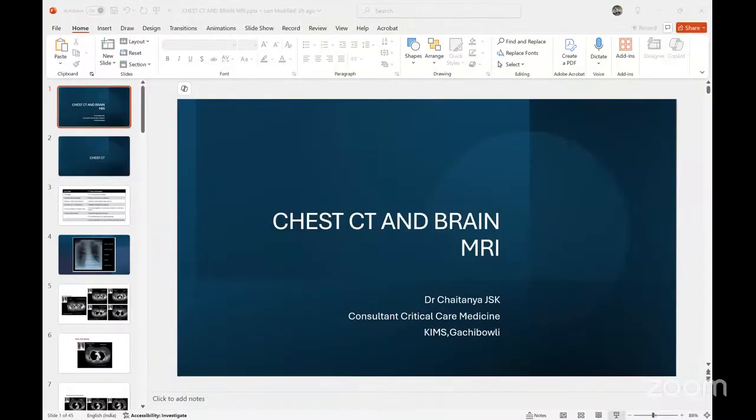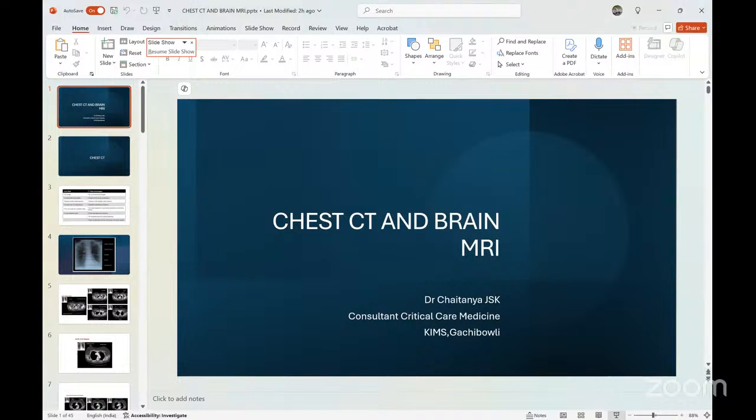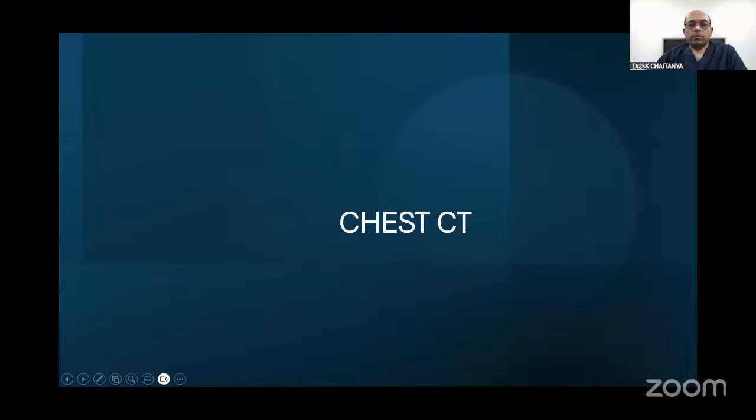Yeah, thanks for the kind introduction. I think 2 weeks ago we had our first session on X-rays and CT brain. Today we'll go forward because these are slightly more advanced imaging modalities, where there is a purpose in why we need to go on to a more advanced imaging modality. I suppose my screen is visible to everyone. Yes. So first, let us go through chest CT.